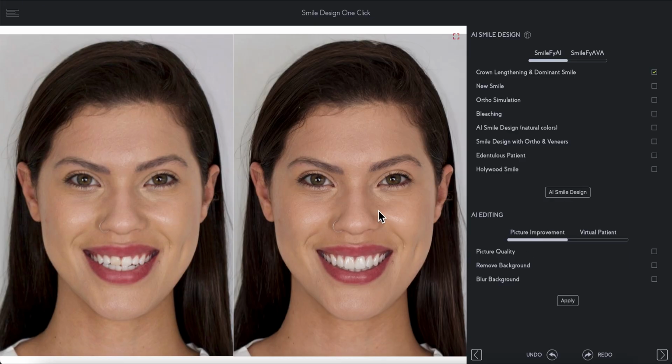Incredible result in just a few clicks. Let's explore some of these options.